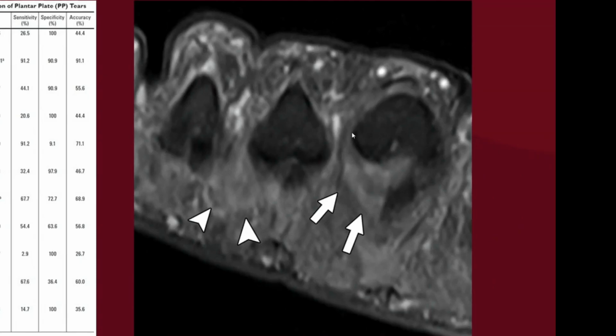But what we're essentially looking at is a region of eccentric perineural fibrosis seen here by these arrows, indicating that the perineural changes have occurred closer to the plantar plate, and therefore the greater amount of pressure experienced on that portion of the nerve may be secondary to a malalignment based on plantar plate pathomechanics.